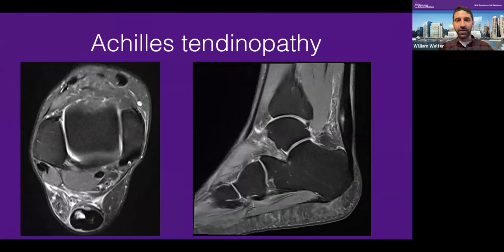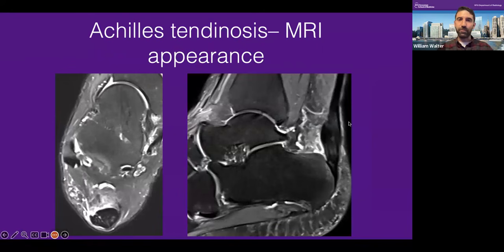All right, another really important and common etiology for ankle pain is Achilles tendinopathy. Here we're seeing the Achilles tendon abnormally rounded. It's almost circular here in cross section, and it's usually flat or slightly ovoid. It has abnormal signal hyperintensity on T2 weighted images within the substance of the tendon. So it's really meeting our criteria for tendinopathy. Has this kind of fusiform thickening, pot belly appearance of the tendon, and that is abnormal.